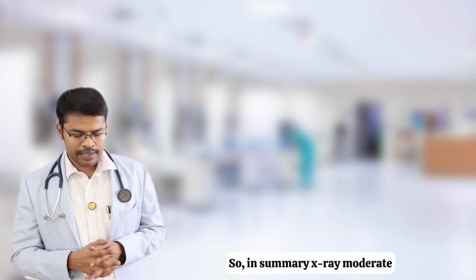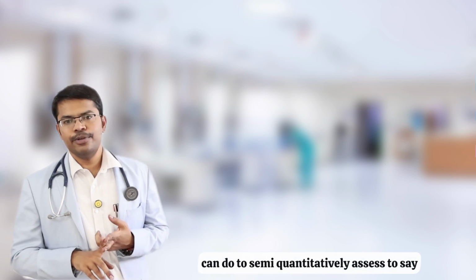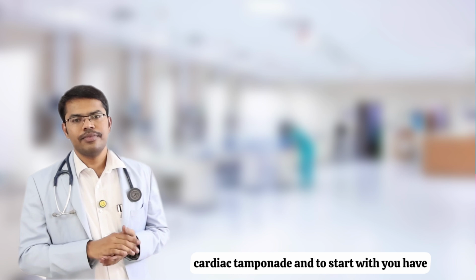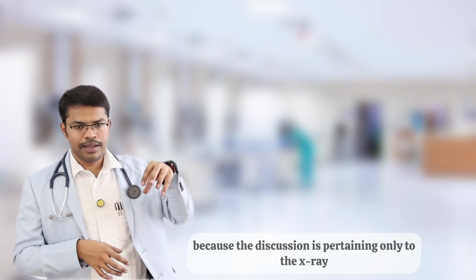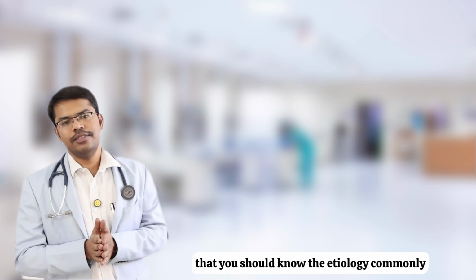That might be required. So in summary, on X-ray, moderate and severe are easy to make out, mild you can't make out. Echo is the investigation you can preferably do to semi-quantitatively assess mild, moderate and severe. And the treatment is pericardiocentesis in severe cases to avoid cardiac tamponade. And to start with, you have to know the etiology, because the discussion is pertaining only to the X-ray and the pericardial effusion. To conclude that, you should know the etiology.